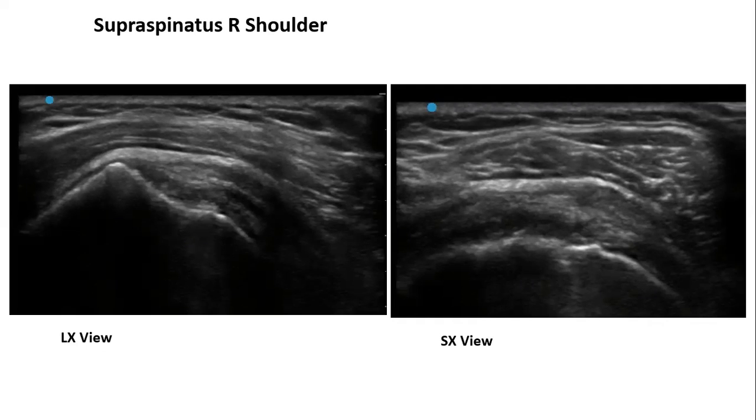Yeah, that's good. And it's herniating into the space because it's thickened, right? So you have to also comment on the bursal thickening. Yeah, bursal hypertrophy. That's good. So you covered all the important points. So that's good.